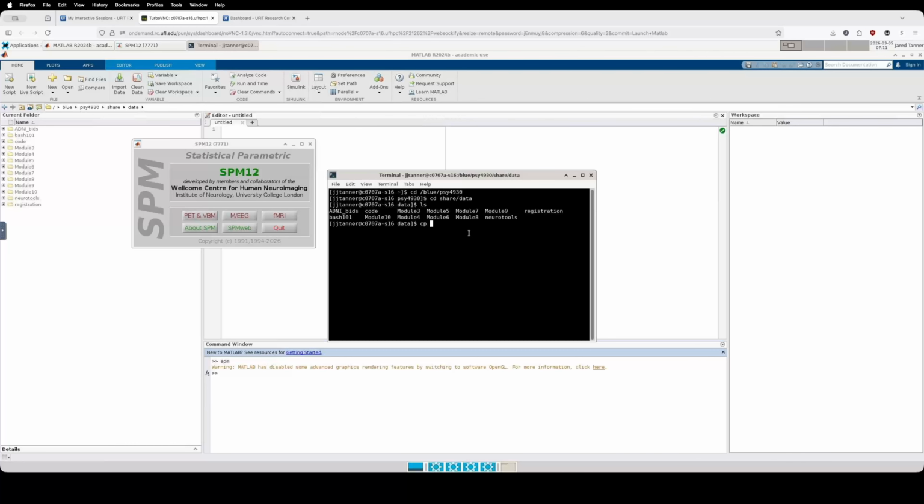So we can copy this. So cp space -sign is what it is. Just what we call the dash is the same thing as -sign on here. So dash lowercase f, which is going to force this to do it. I do a capital R, which is recursive, and then space, and then you can do module 7.